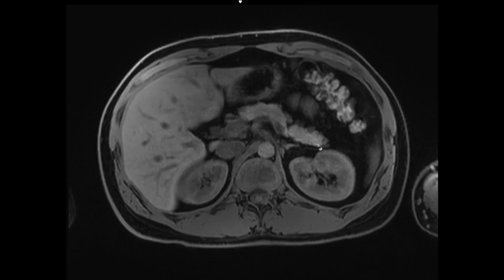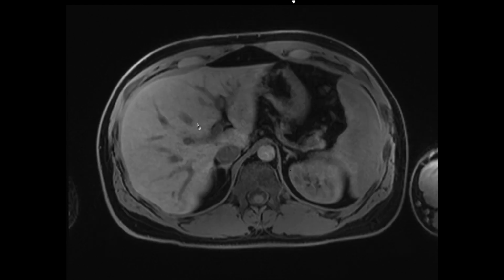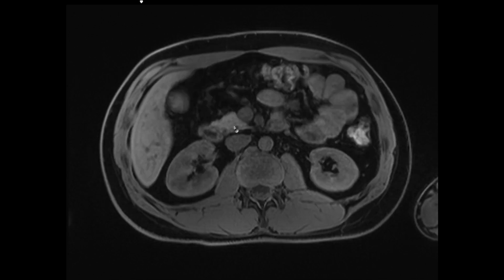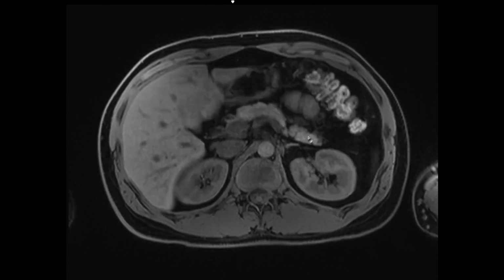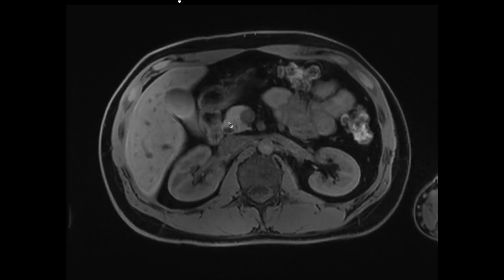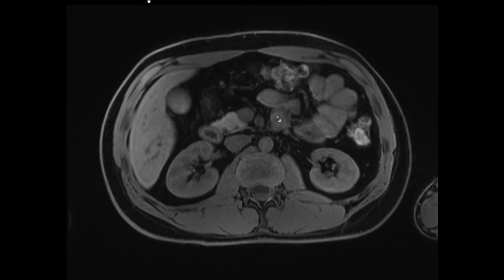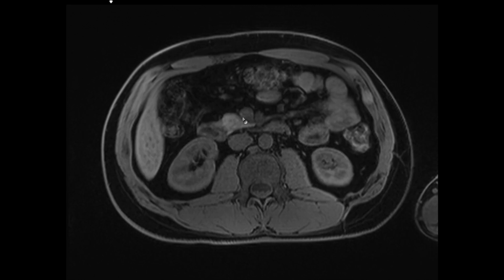But notice how bright the pancreas is on T1 weighted images. So we talked about the liver, how it's bright, and how things are going to look dark in comparison. But the brightest organ on T1 weighted images in the abdomen is the pancreas, and look how beautifully it stands out here and how bright it is. When you have things like chronic pancreatitis, the entire pancreas can start to look a little bit darker, and that's an earlier finding in chronic pancreatitis. But the thing you're really looking for here is if it's very bright and you see a focal area or a focal lesion that's dark, you know that that's abnormal and you want to look at it closer on the other sequences. So the T1 weighted images are really good for looking at the pancreas and making sure it's normal.